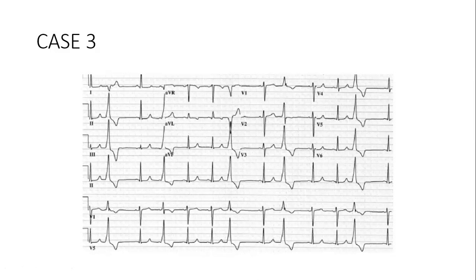Will that not be a QRS complex? Look at this. We have a P there. I know it's a small P. We have a QRS, we have a T. And then we have this. How is this different from this when you're looking at it? So what does that tell you? Where are these from? Is it not a PVC? Premature ventricular contractions? Yes, these are premature ventricular contractions.